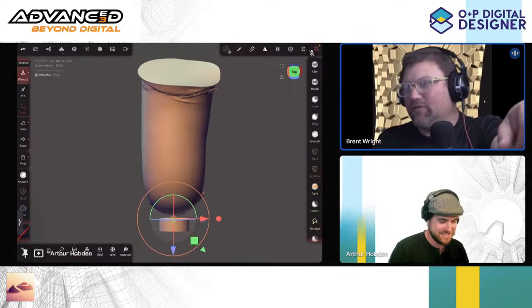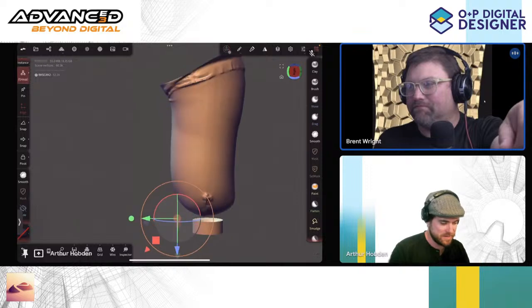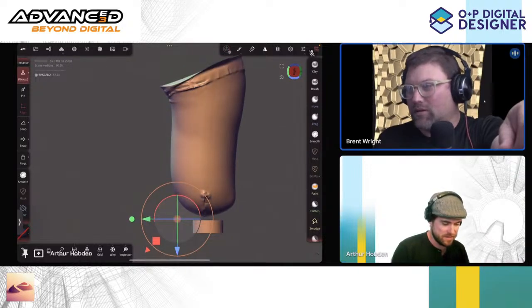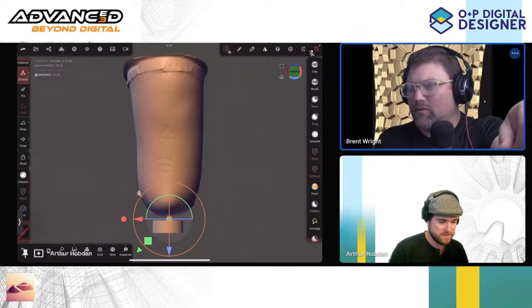Can you see the hamstrings? You can see the flare, right? Yeah, it's not too bad. Looking at it from the side, I like that. Yeah, you like that? Okay. Front.